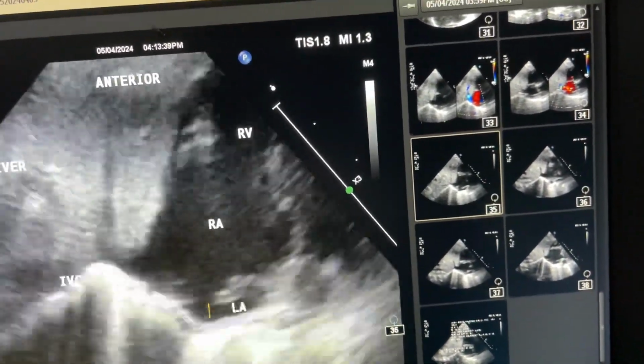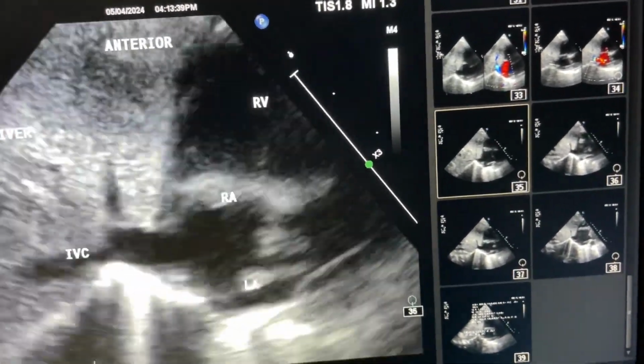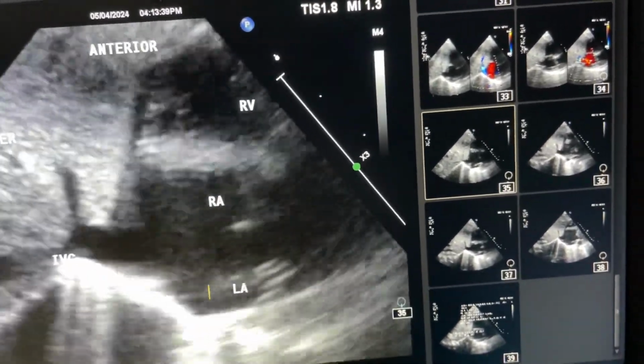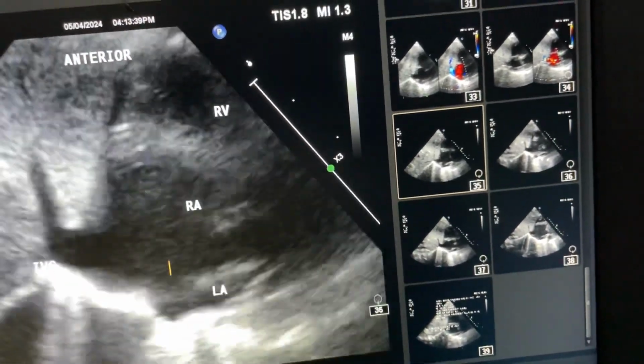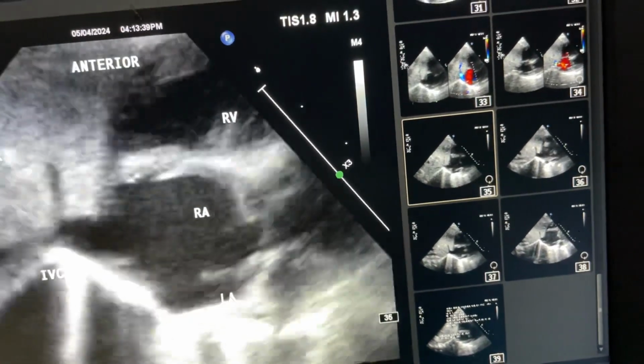But in case of sinus venosus ASD of IVC type, you will see right lower pulmonary vein is communicating with right atrium directly, almost where the IVC also joins, the right lower pulmonary veins also join.